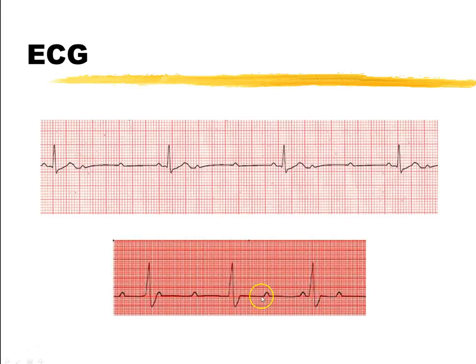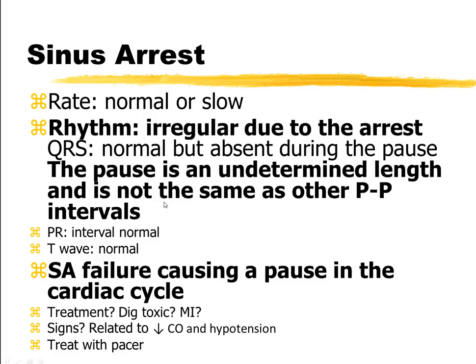If you measure them out, they are the same. There's a P wave here, but you can't see it because it's hidden behind that QRS complex. So it's not always cut and dry, super easy. But the key elements of a third degree heart block are that your P waves are greater than your QRS's, they have no relationship to one another, and it's a slow rate.